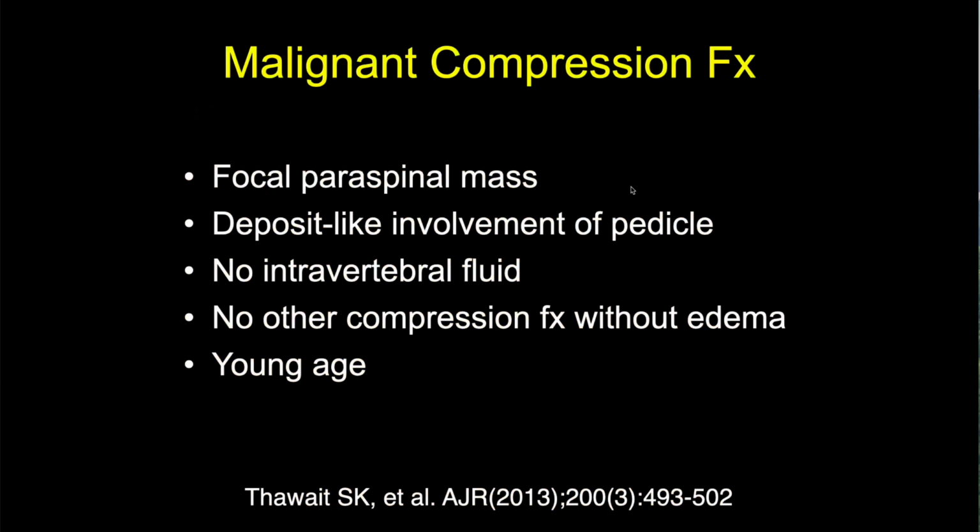Malignant compression fractures, you'll see focal paraspinous masses, and involvement of the pedicles. There's no intravertebral fluid, which you'll often get with hematoma and spaces in osteoporotic fractures within the vertebral body. No other compression fractures. And malignant lesions tend to be in younger people, though they certainly can be in older people, whereas the osteoporotic fractures are almost all in older people.